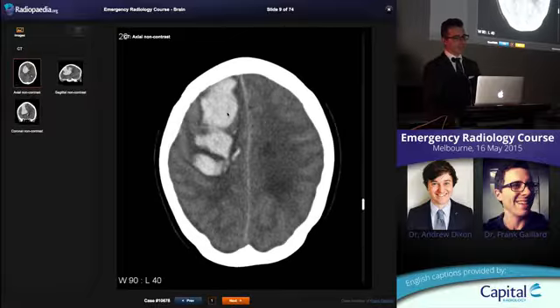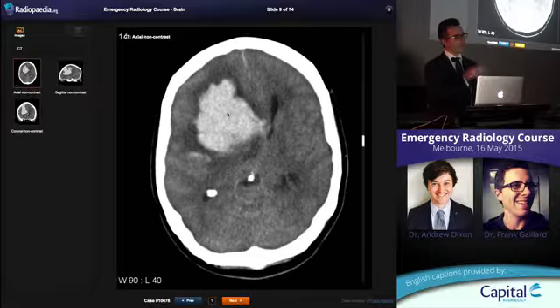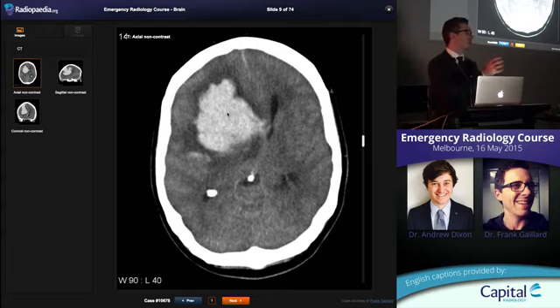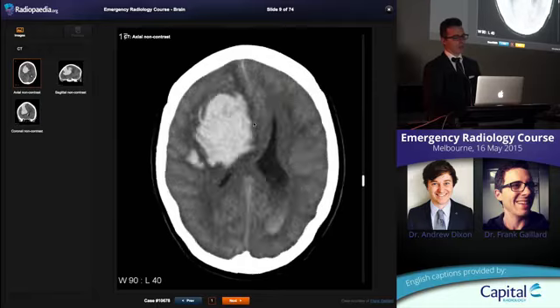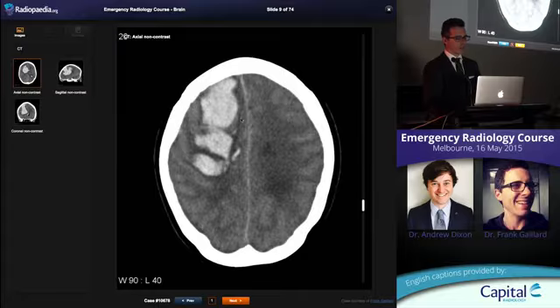And it can also track down inferiorly through the white matter tracts. Remember, white matter is predominantly axons that can just act as a guide for fluid or blood or edema or tumour cells. And here it has ruptured into the ventricles. But this peripheral component is characteristic of a lobar hemorrhage.